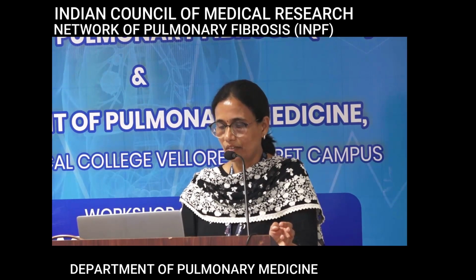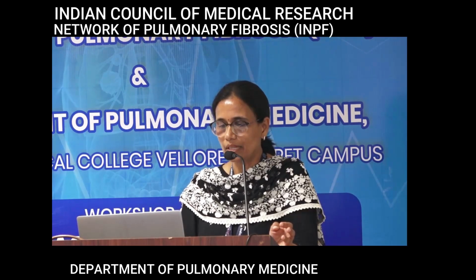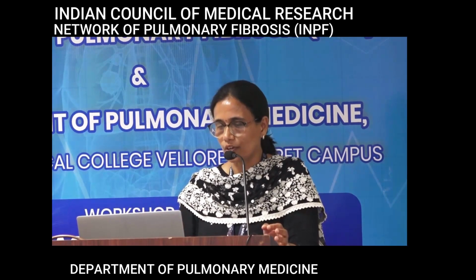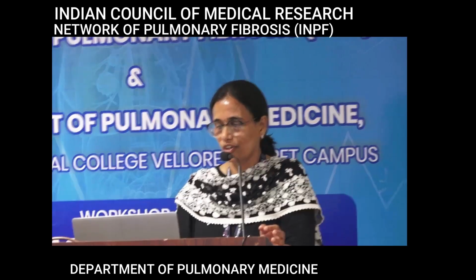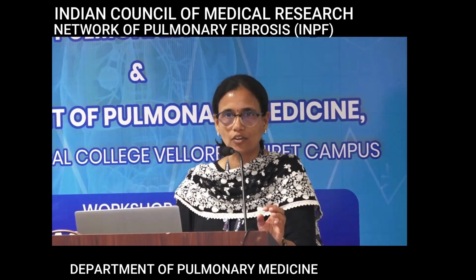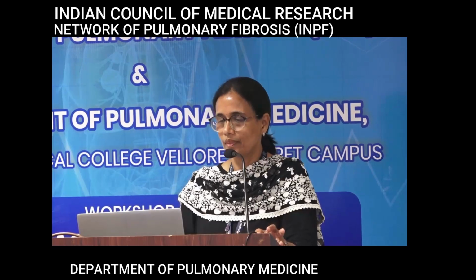What is this? Again, we are seeing lymphadenopathy, and we are seeing a lot of nodules, a little bit along the fissures, but mainly here what we are seeing is along the peribronchovascular. So that is also the central interstitium. So peribronchovascular nodules. Here we are seeing nodules along the bronchi, so peribronchial nodules, and here perivascular. So all these are examples of perilymphatic nodules: peribronchovascular, perifissural, and subpleural.